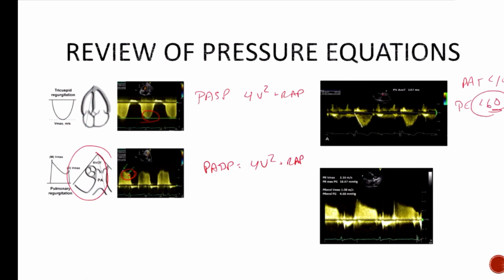We also know that we can calculate our mean PA pressure using this velocity as well. Can anybody remember that equation? Look at you. I love it. Okay. And those are the main features of what we're looking at here.